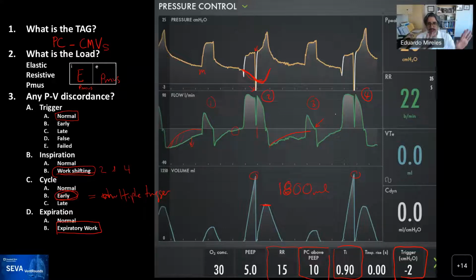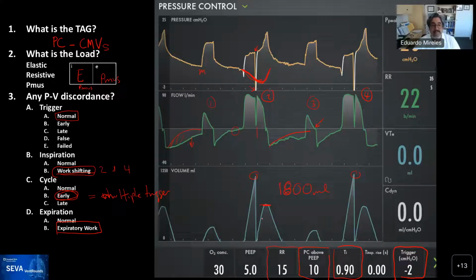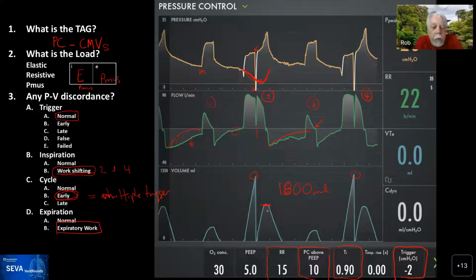It's a completely off rhythm. It seems that the patient is going at its own rhythm. The ventilator is doing whatever we set there at 15, but the patient is going completely off rhythm. And the clinical message here is that the volume waveform is completely misleading. Yes, because it resets. And so really that patient had those two peaks stacked on top of each other, as you indicated. And even if you had an alarm set, it wouldn't have picked up how bad this situation was.